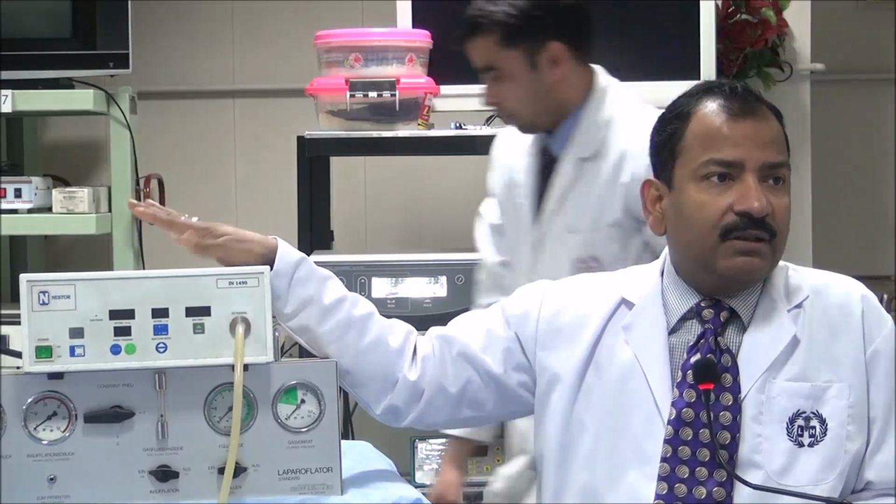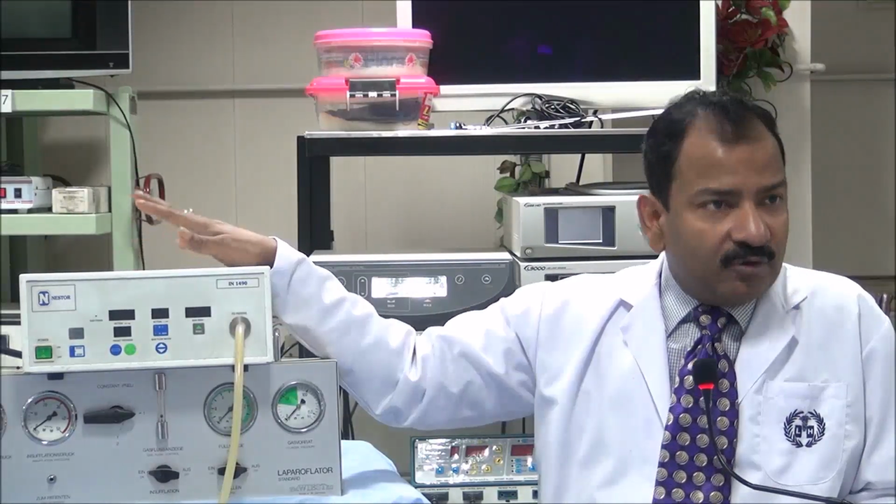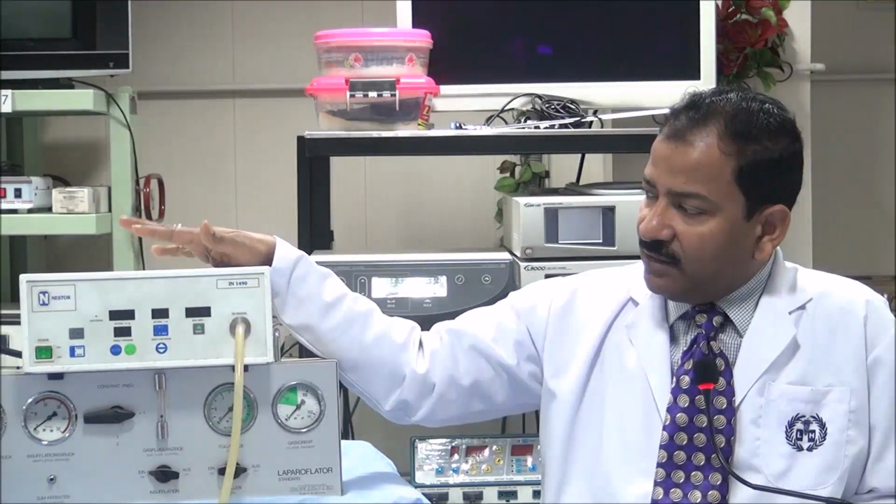First, I am going to discuss today the insufflator. After that, I will discuss telescope, camera, light source, light cable. All the electronic part I am going to discuss today, except energy sources. Energy source we will discuss later. Energy source means monopolar, bipolar, harmonic, ligasure, that I will demonstrate to you later.